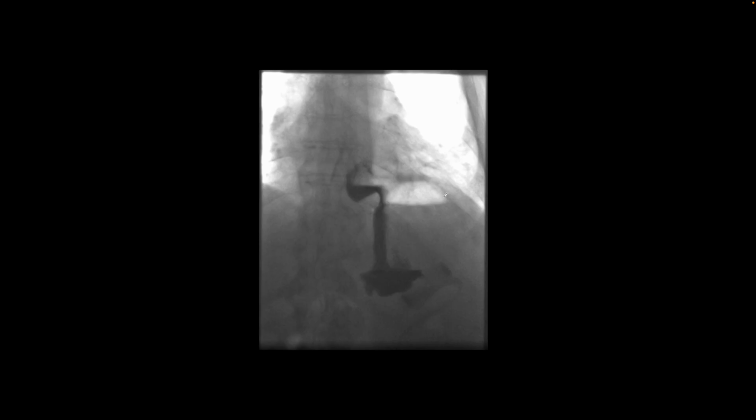This is our next patient. We have a single image from a barium study, and the patient has swallowed the barium, and we see it in the distal esophagus, GE junction, and going further distally into the stomach. The interesting finding here is that this is the fundus and the air fluid level in the fundus, and right here is the gastric lap band.